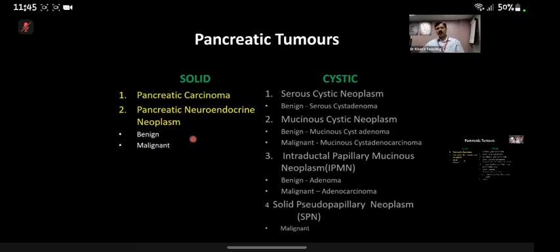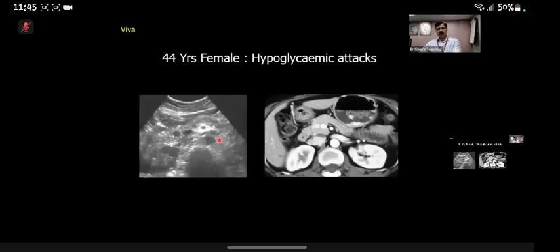Extremely important for the exams, and I'm going to show you what can be asked in the exam. Now, first of all, candidate 7, can you tackle this film? So I've got an ultrasound image here, and I've got just one late arterial phase, early portal venous phase type of scan. Over to you.